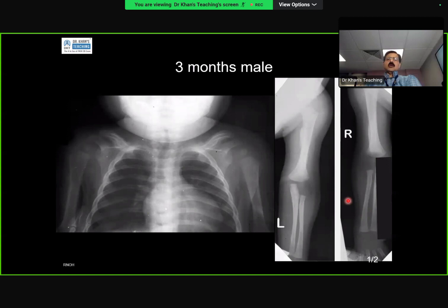This is your last case, and then we will go to candidate 6. Okay. What is your diagnosis here? Okay, go through your findings, should I say. In this 3 months old child, in the x-rays which have been provided to me, I think there is some periosteal reaction which I can see in the right distal humerus, and in the ribs, and in the clavicles again I can see that there is some periosteal reaction.